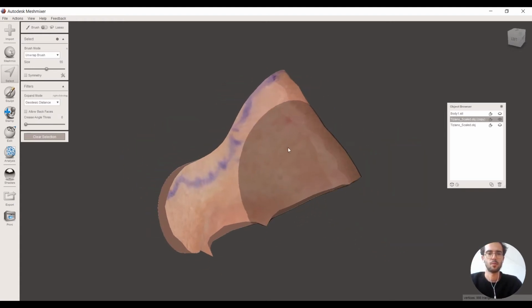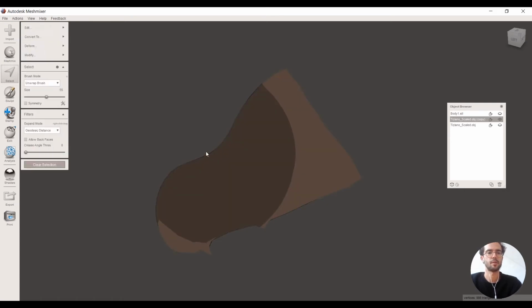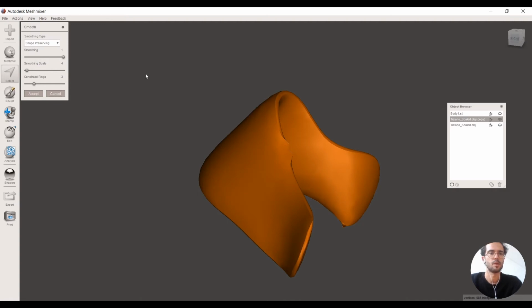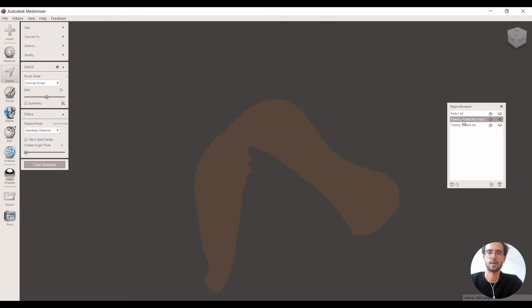And now we can select again everything, edit, deform, smooth. So I got rid of these spikes that I had before a little. Don't overdo it because we can correct them a bit better later. When you smooth things, you kind of make them smaller, so I don't want to exaggerate, I make just a little less, like this is fine. That's because I can also use other tools to scale down things.